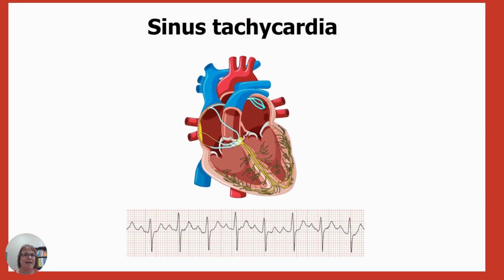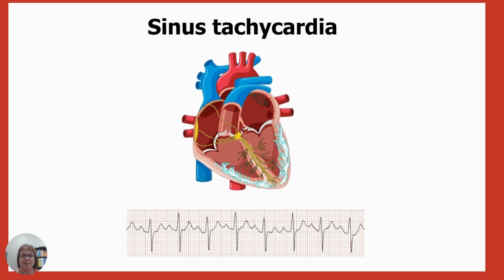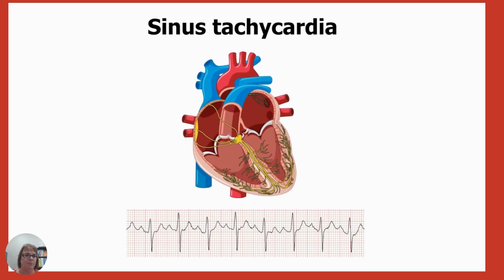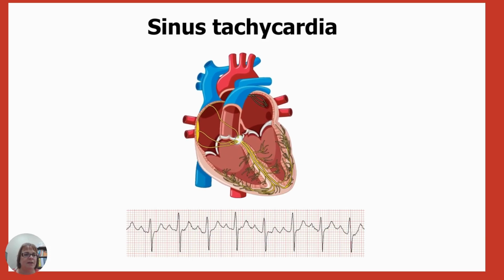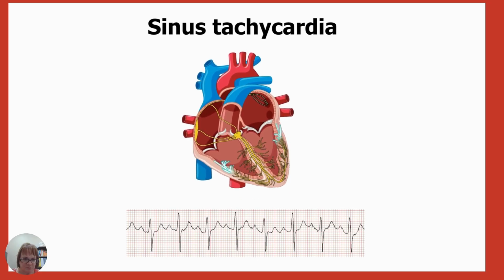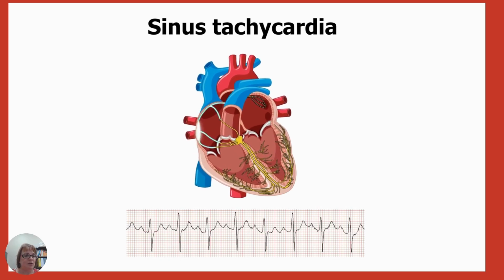The next one is sinus tachycardia. So it's beating fast. When somebody's heart is beating this fast, it's difficult for those ventricles to pump the blood out because the atria are just squirting so fast. They squirt and then stop, squirt, stop, squirt again. So it makes it very difficult to get a full load of blood to pump to the rest of your body. So patients with sinus tachycardia might feel lightheaded, dizzy, because they would have decreased cardiac output.